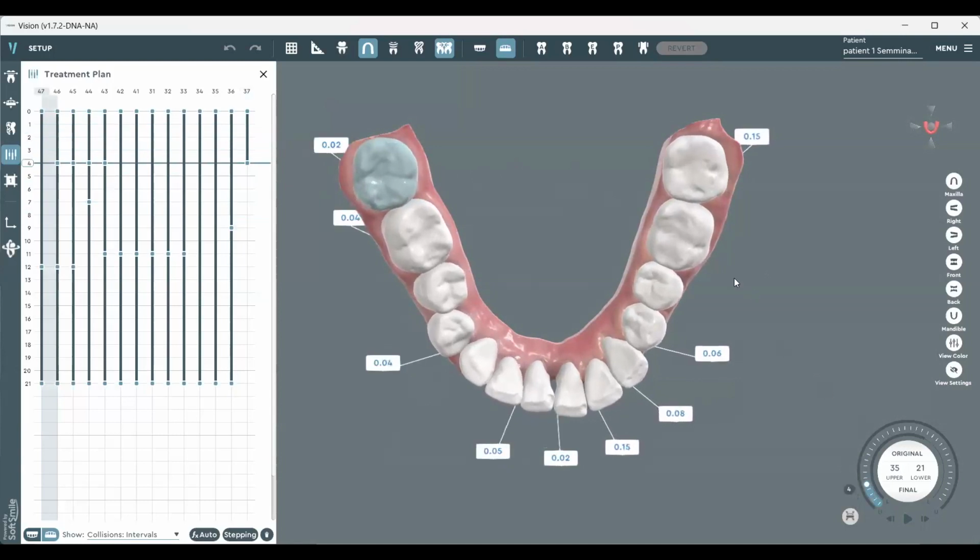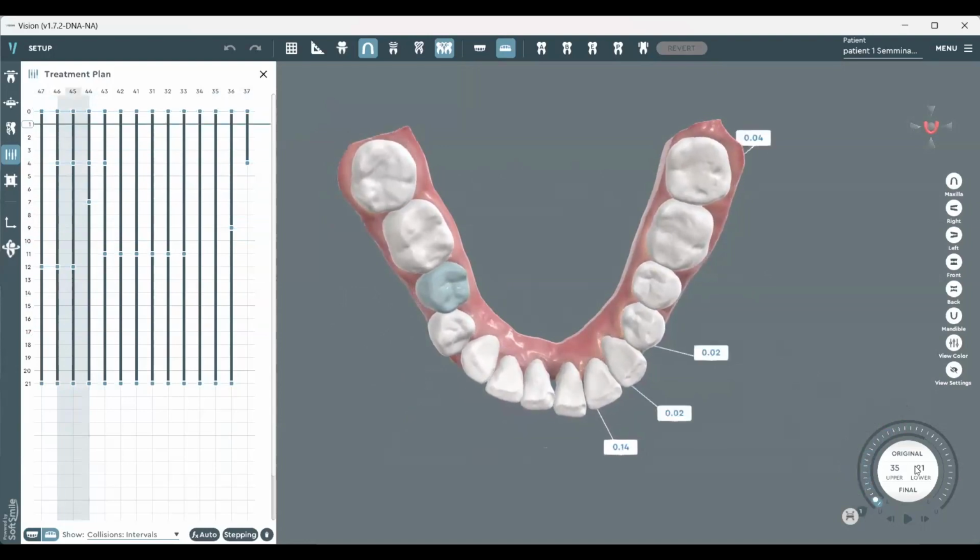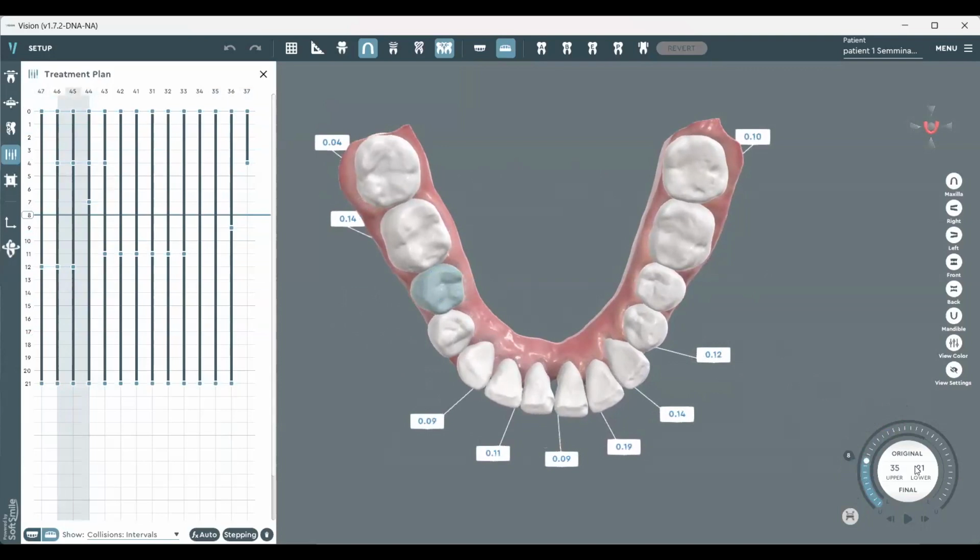And that will make the aligner create more pressure on the premolar sides. So we expand the premolars and contract the seventh. And you can see how there is a space between the molars and premolars during this process to be able to open the spaces correctly.